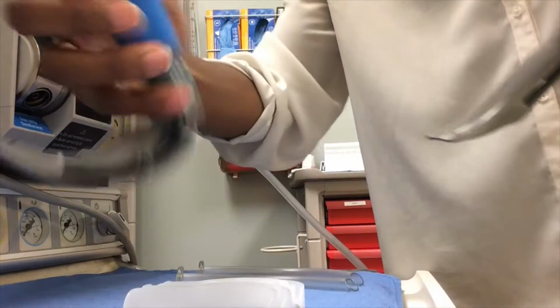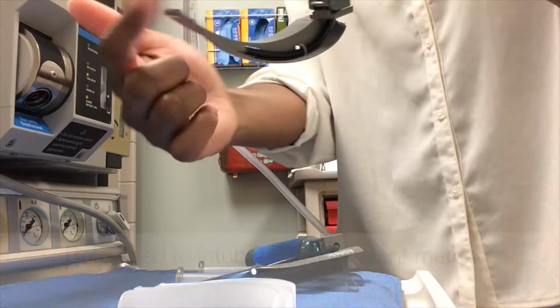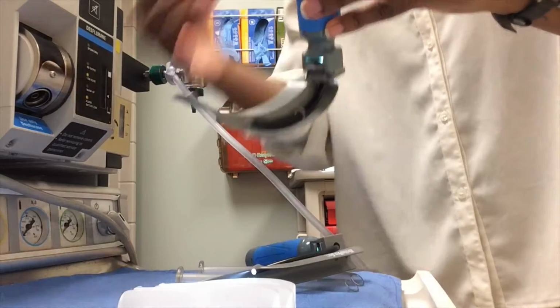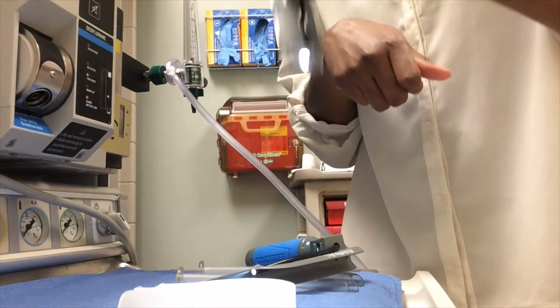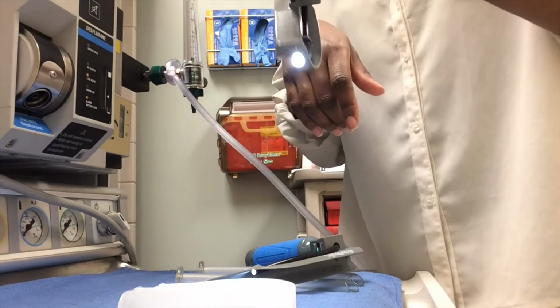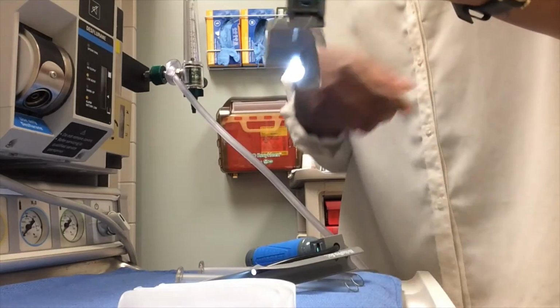So the differences between these is that when you are using this to intubate, you always intubate with your left hand, no matter if you're left-handed or right-handed. You use these blades for two different things. The Mac goes into a space above the epiglottis. Find the glottis, and then the Mac goes right above it into that space. So you put this above the epiglottis into a space that's called the vallecula, and indirectly, when you push it, it lifts the epiglottis up and allows you to view the glottic opening to stick in your ET tube.